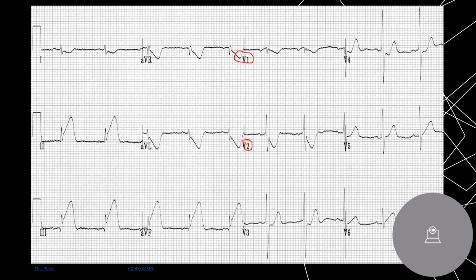It's deceptive, okay? So this is one cardiac complex, right? This is a second cardiac complex. So there's your P. Let me get my little highlighter out. This guy. So P, QRS, T. T actually looks pretty good because if you go baseline, termination, like that's pretty flat.